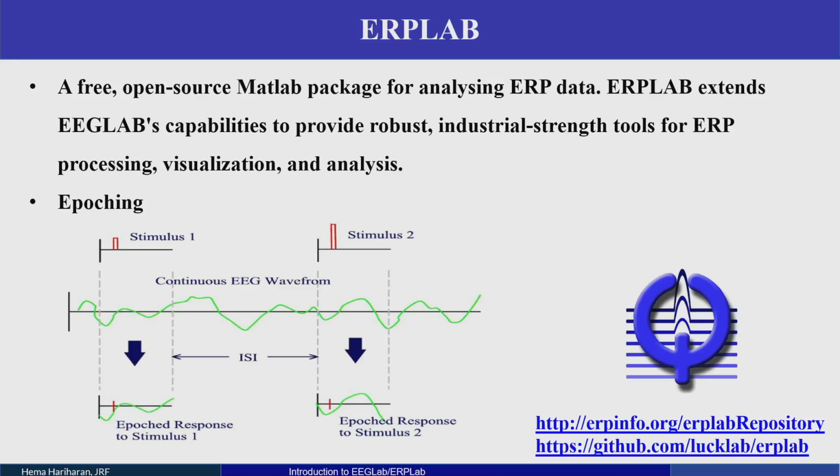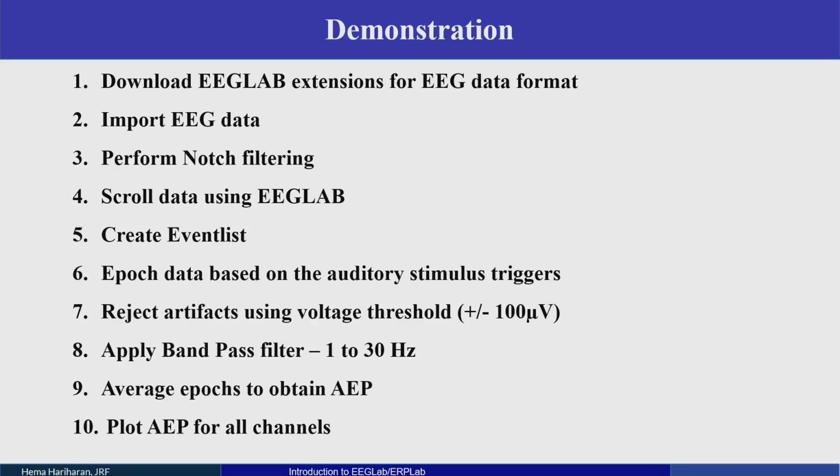So for this I will show you how to do the various steps for AEP with EEGLab and ERPLab. And these sites I have mentioned over here, where we will be obtaining all those EEGLab and ERPLab zip files, and we can download them. How to import that into our MATLAB, that also I will give you as a demo. So these are the demonstration steps that I will be covering.